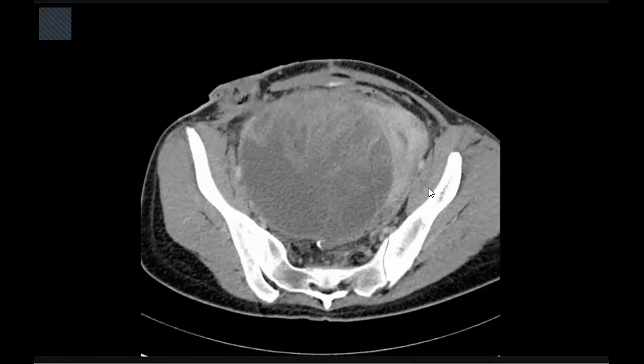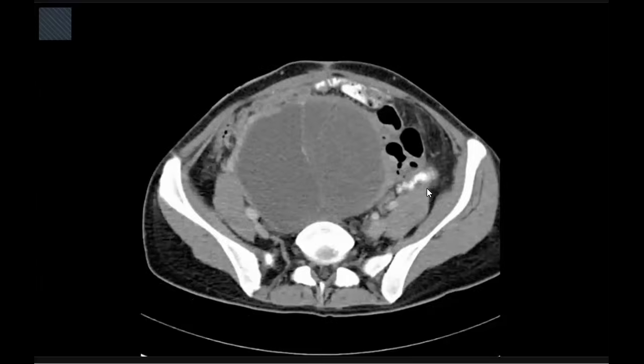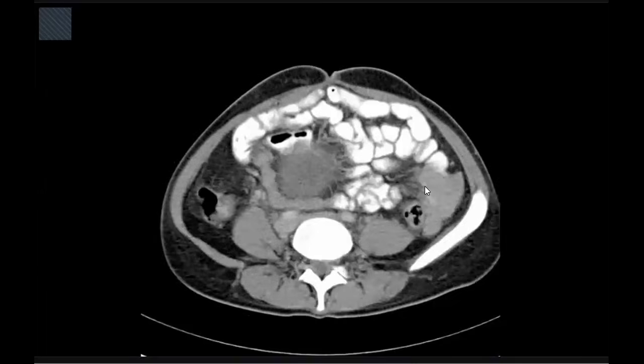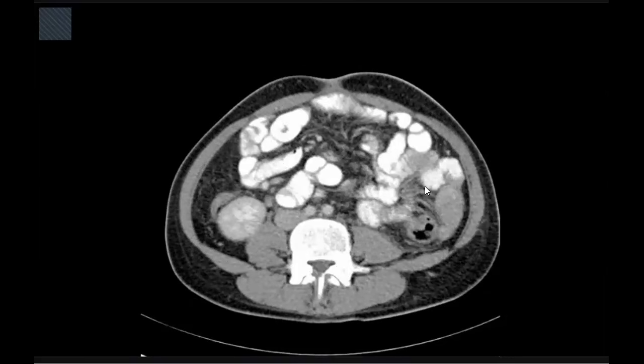Patient has the colostomy before, and this lesion is a desmoid in the pelvis, extending up to the lower abdomen. Does desmoid sometimes arise from the ovaries?